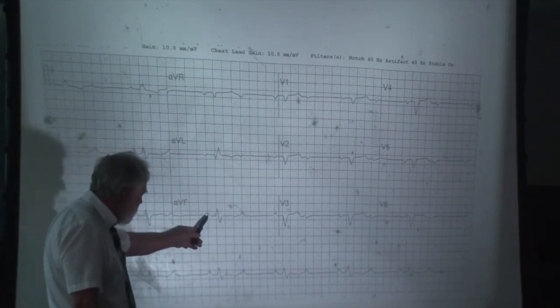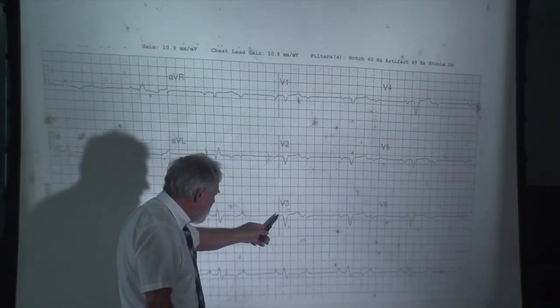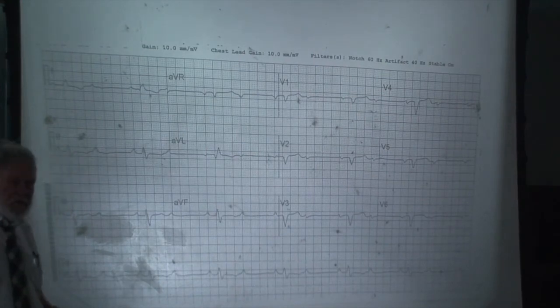Not conducted, is conducted, not conducted, is conducted. And it's not Wenckebach because every one of those PR intervals is exactly the same across the board, okay?